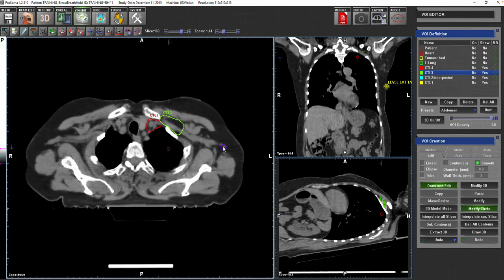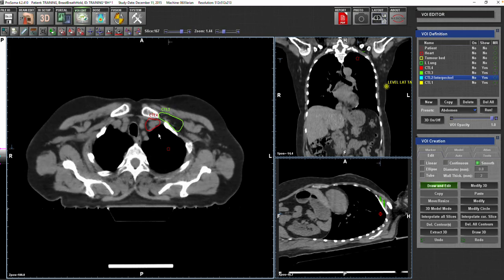Believe me, when I do it, it's in a blink, and that's for me because we usually work on what we call the field-based supraclav fields. We don't usually contour everybody or plan everybody, and I'll show you how to put the field now, but I usually do it like that in a very quick way.